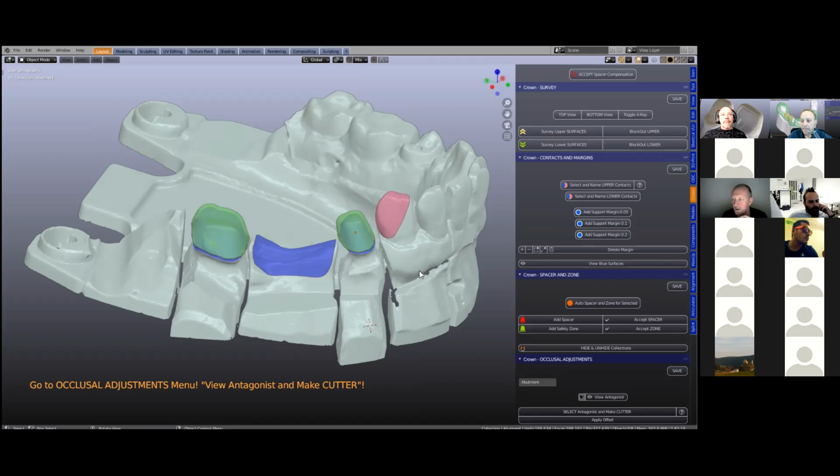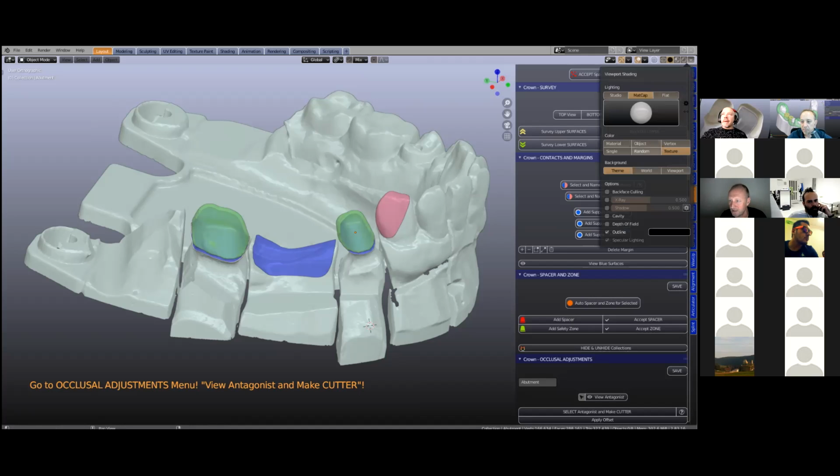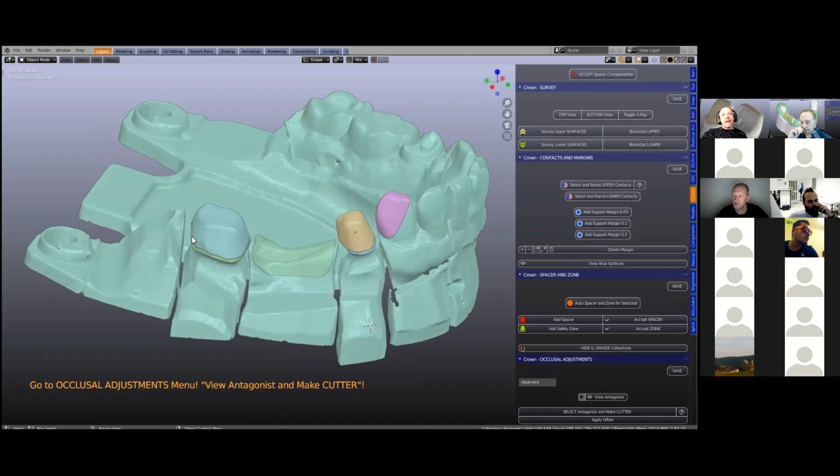Yeah, I can actually see the logic behind your reasoning on that. I just wondered if it gets mixed up, where do we go back to default so we can restore what you guys have put in there? But if you say it's in the settings, sorry, go back to that again. You went to texture, wasn't it? That's it. It's random. If it's set to random, it'll change.